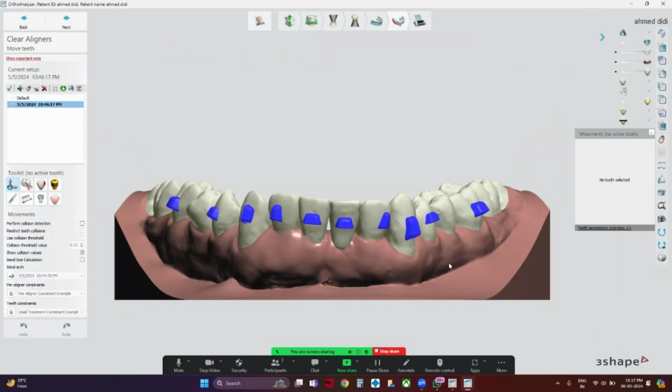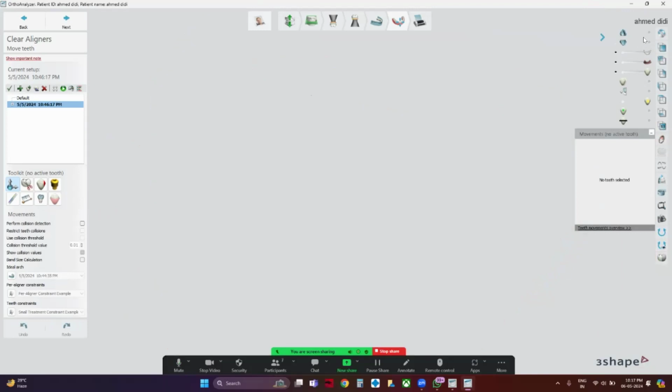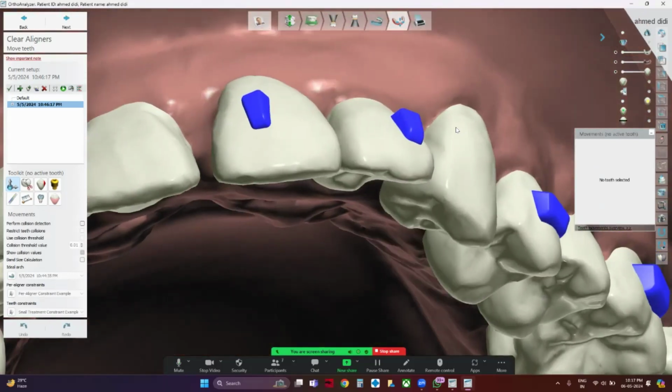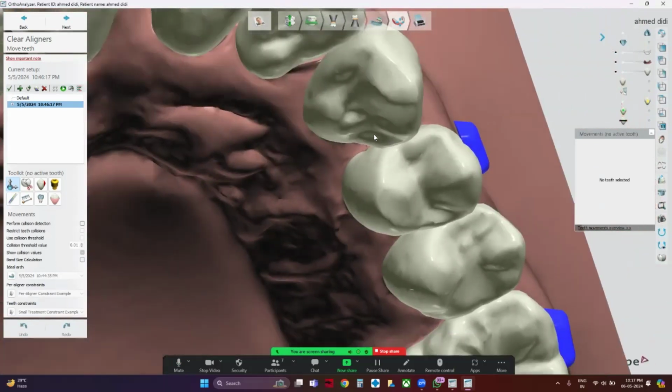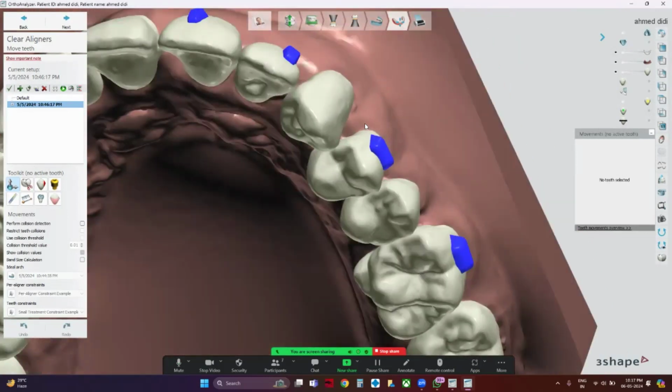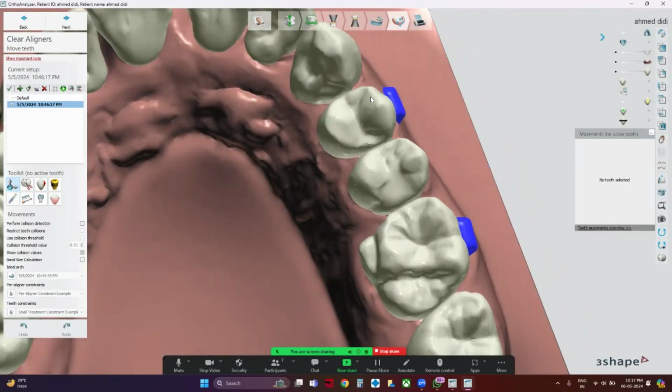Okay, Mayank, I knew this fact that you have told just now, but the problem was I could not start the staging and timeline thing until I did the sub setup. Yeah, that's correct. That's why I had to do the sub setup to see the timeline thing, because you had told me in the morning. So I wanted to reduce the timeline, and for that reason I did the sub setup.